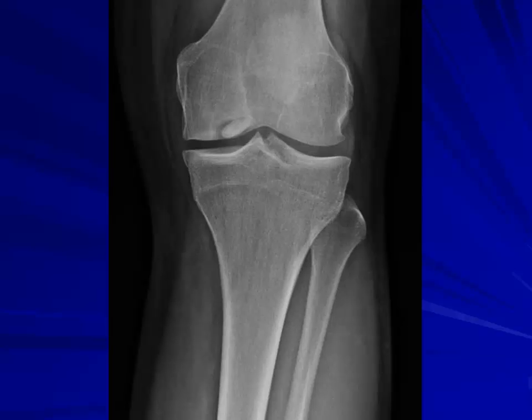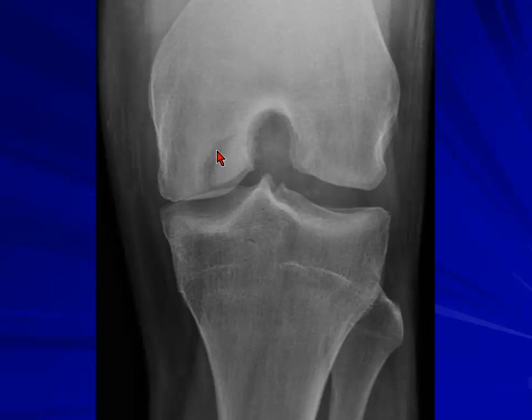Yeah, OCD. So that's the lucency, that's the bone, so that's a fragment. Again, these are the common abnormalities you see, and especially in bone scan when you see focal uptake, don't just discount it and say it's just nothing other than arthritis. This is commonly seen, and that is commonly the cause of the pain.